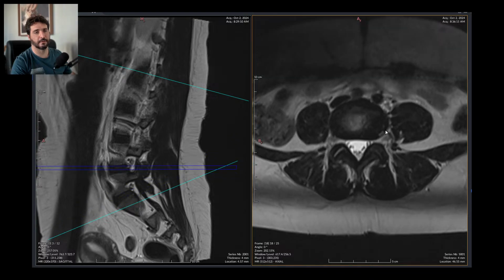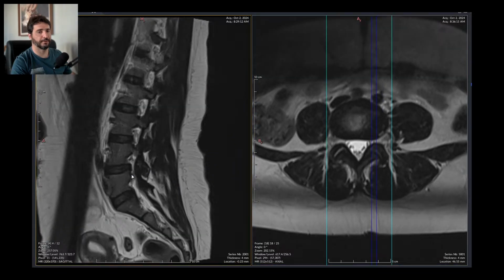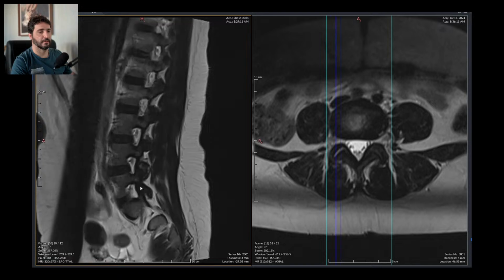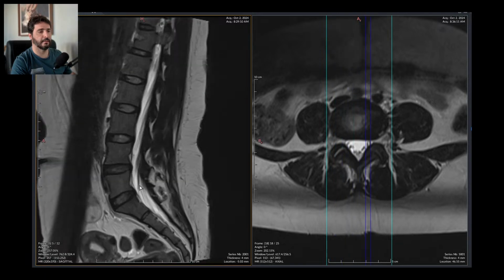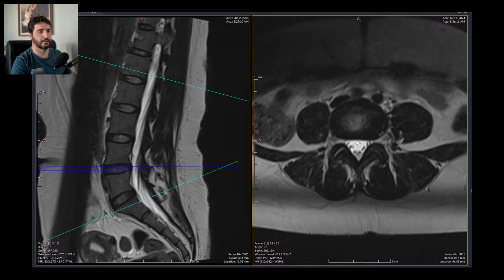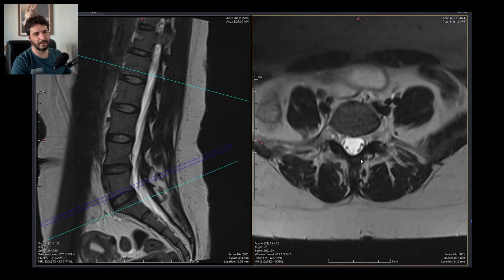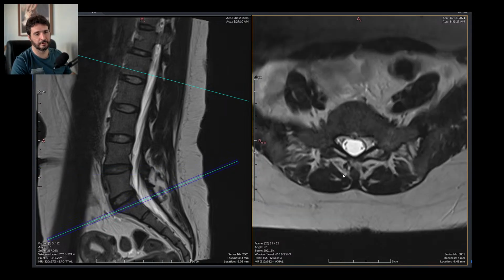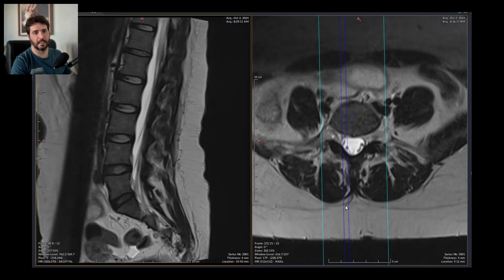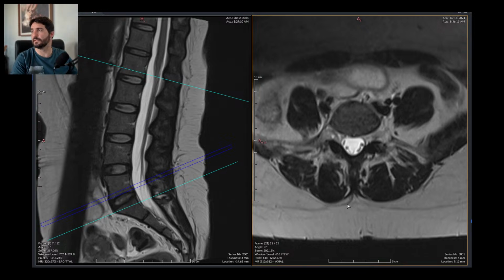There is another rupture right there. This is very tiny. A tiny protrusion. I can't really tell it's a proper protrusion because it's so tiny, so I'm going to ignore it. And also hypertrophy and fat.